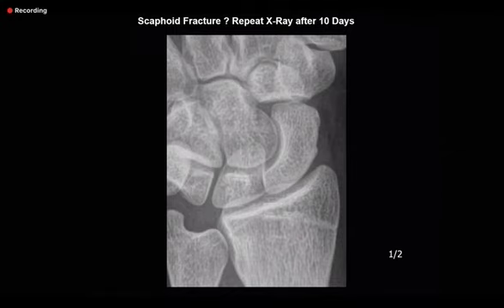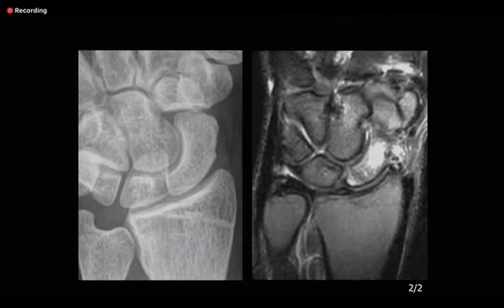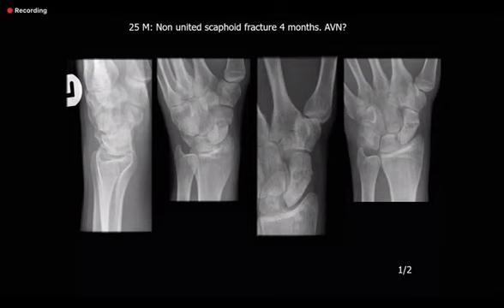As was pointed out, in many centers in the UK we are now doing MRI there and then instead of waiting. But in many centers, of course, availability and capacity are also factors. These cases have come in the exam quite a few times. They are easy cases. They can also come in rapid reporting. Avascular necrosis, for example. What are the signs of avascular necrosis here, candidate 3?